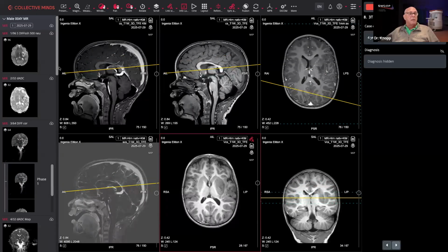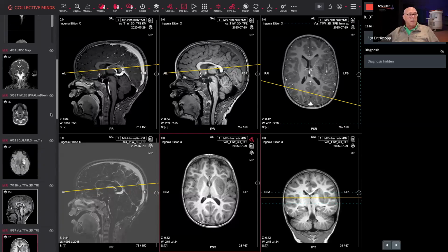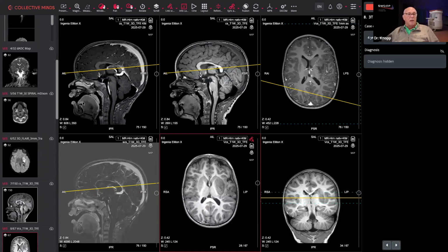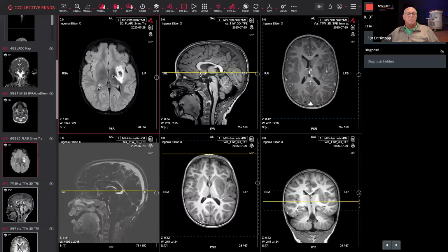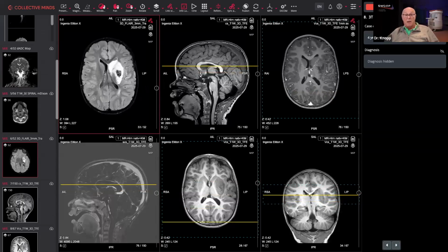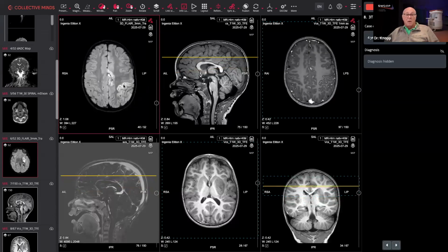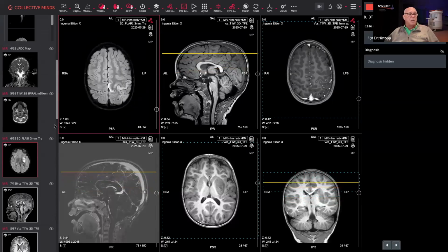If we pull up the, I think the FLAIR image is a nice image to show. And again, we see that there's evidence of signal abnormality, edema with some dark signal, and there's blood product here. And we can see the areas of ischemia, also with FLAIR signal change.